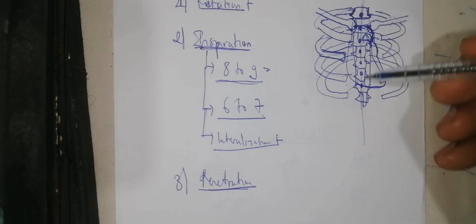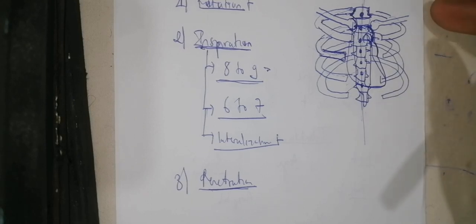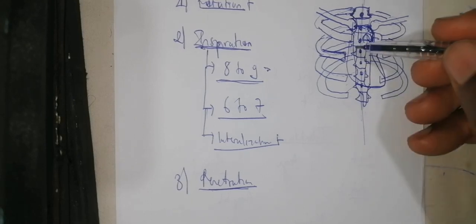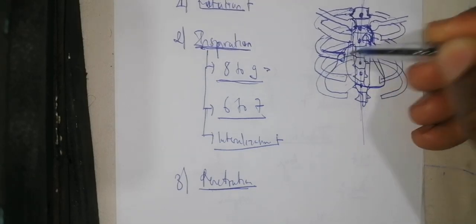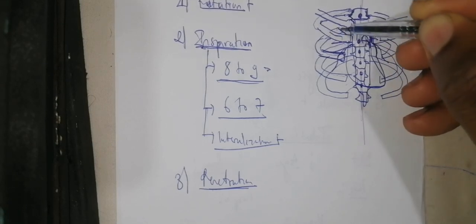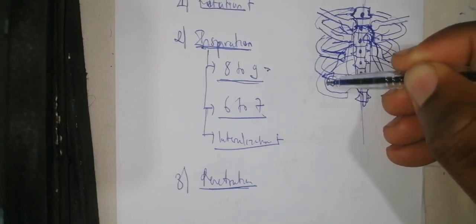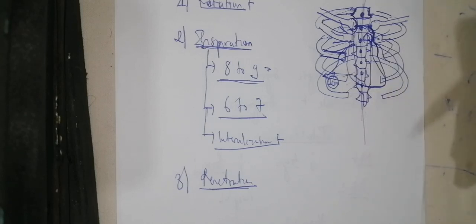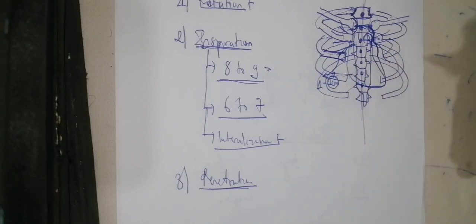So for a good penetration, you need to see the vertebral column or the spine behind the heart shadow. Another element for good penetration: you need to know that the pulmonary vessels, which are opaque fibers, should be at most 2 centimeters away from the thoracic wall. So when you see the pulmonary vessels 1 to 2 centimeters away from the thoracic wall, ensure that there is also a good penetration on the X-ray. So that's a good quality.